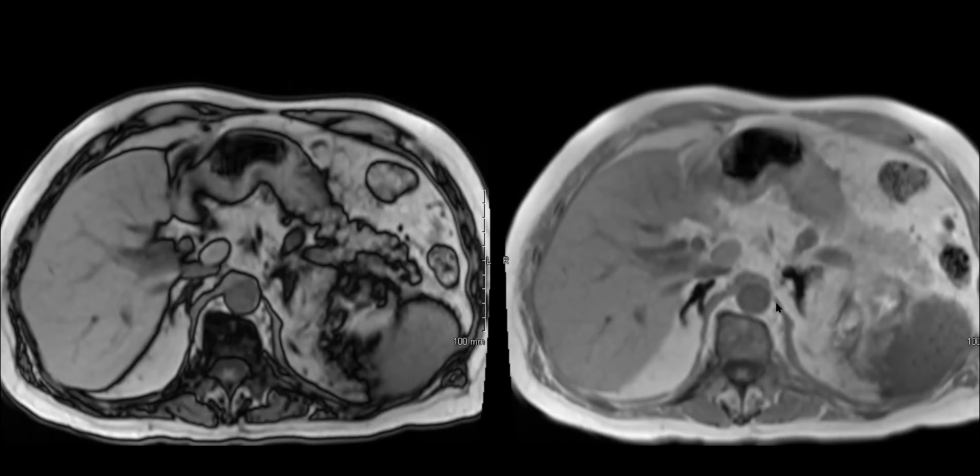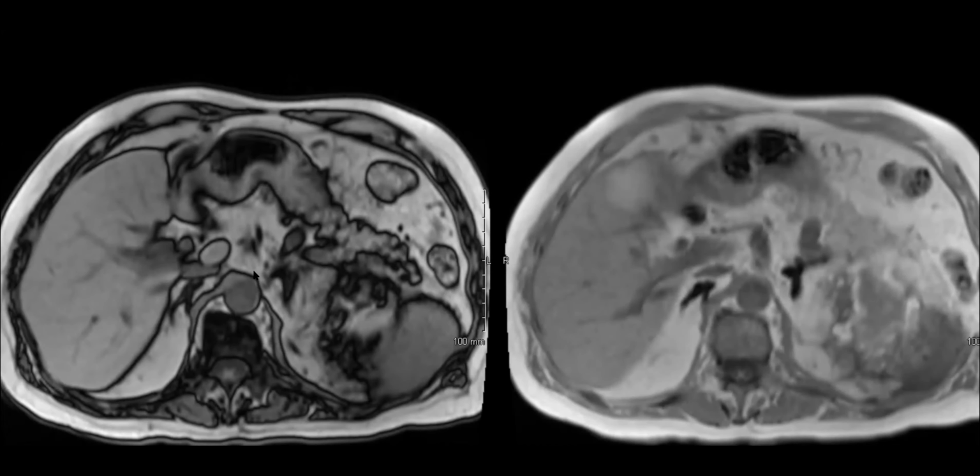So yeah, even, no, I'm kidding. But it's an important thing, right? Because the fibrous tissue doesn't cause susceptibility artifact because it's not a paramagnetic substance. But here we're dealing with deposition of something that indeed is very paramagnetic, and causes loss of signal.